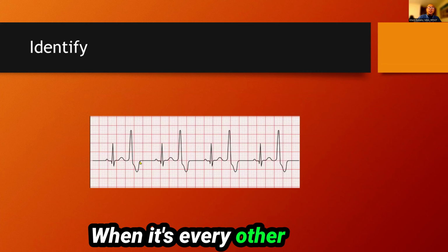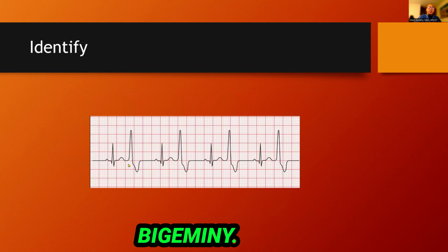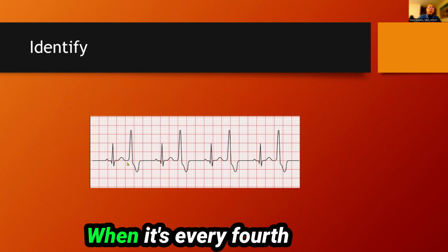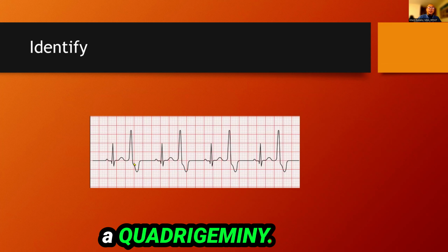When it's every other abnormality, then this is a bigeminy. When the abnormality is every third pattern, then that's a trigeminy. When it's every fourth abnormality, then that's a quadrigeminy.